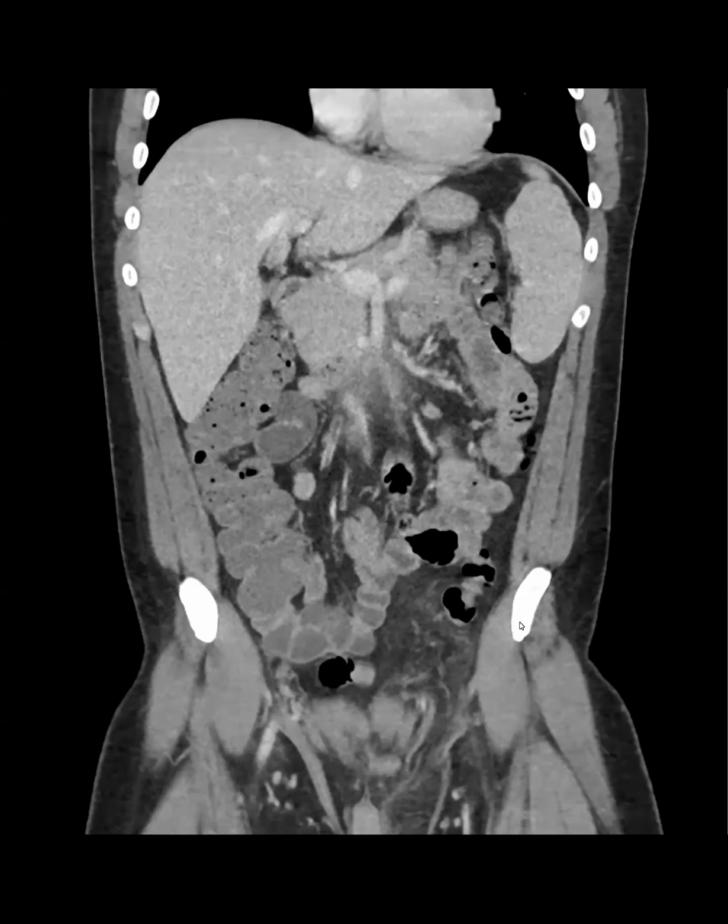Any ideas in terms of differential considerations that you would put into this, not knowing the history? Some kind of vasculitis. Yeah, small and medium vessel inflammation. Yep, exactly. Any collagen vascular disease or connective tissue disease? No. Okay. There's a splenic lesion.